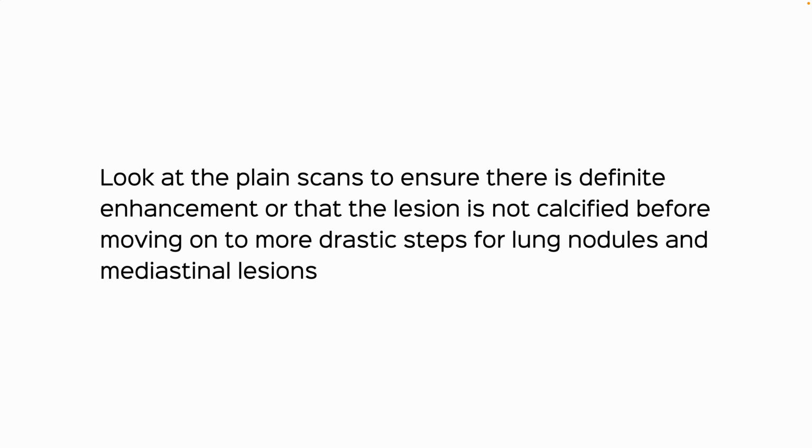So the moral here is that you should look at the plain scans. Forget the moral, I hate that word. So the learning here is that you have to look for definite enhancement. If the lesion is not calcified, look at the plain scans. If the lesion is calcified and doesn't enhance, you can leave it alone. That's the important thing.